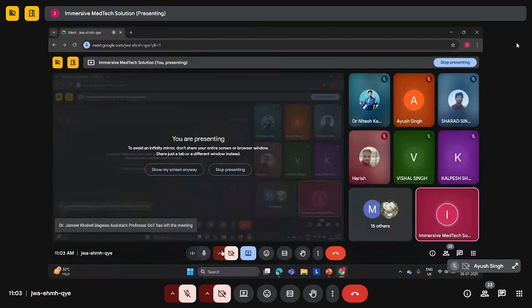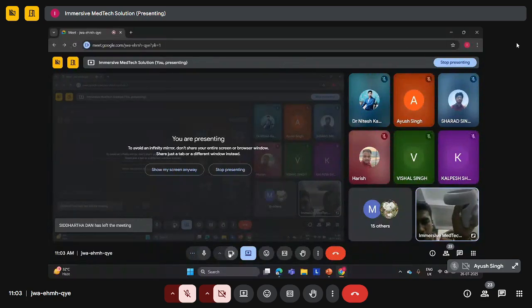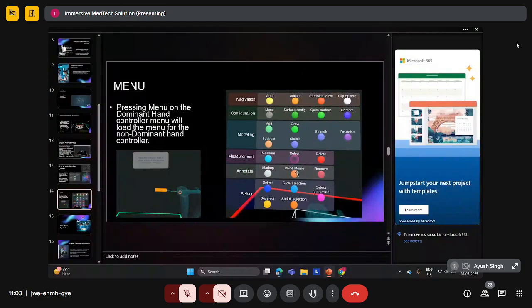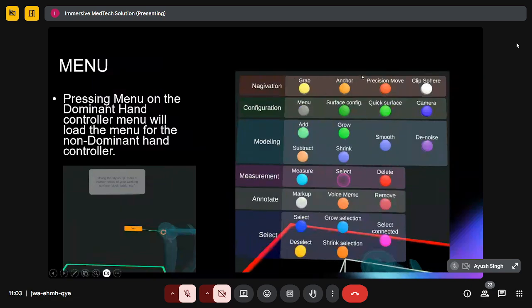So for example, if I am using this set of operations, and this being my dominant controller over here. There are different buttons in this mouse. This being the dominant button that we would be using to open the particular menu option. Now, once we have loaded the menu option, we have the next task, being to navigate through the different options that are present.